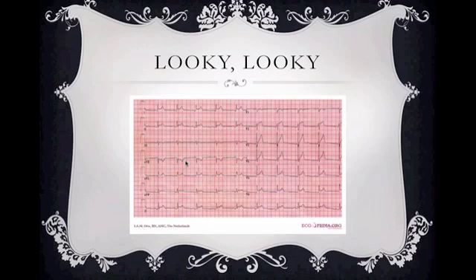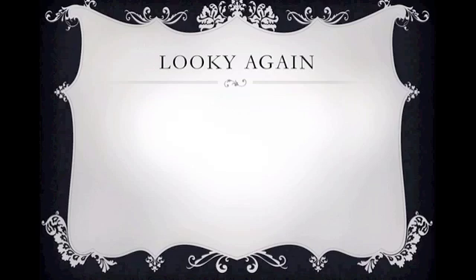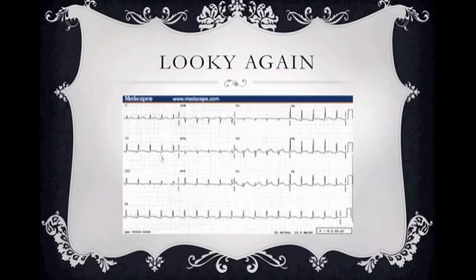All right. Let's look at lead 3. I have no ST segment elevation in lead 3. This is classic for pericarditis, just like our rules said. All right. Massive ST segment elevation in V1 through 6. ST depression in AVR. No depression or elevation in 3. This is pericarditis. Look smart next time you go to work. Well, let's look again. What do we got?